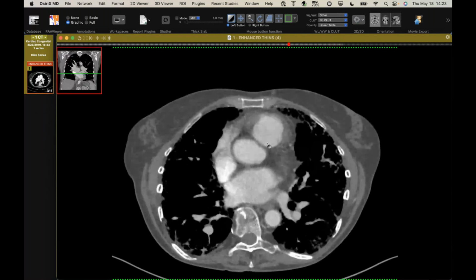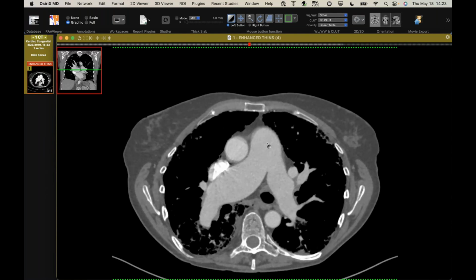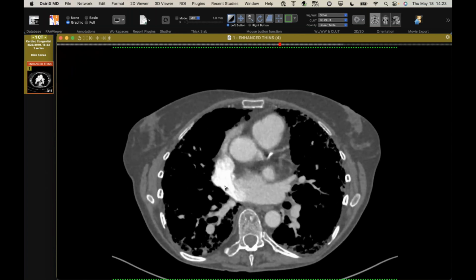You can see pulmonary hypertension in the setting of fibrotic lung disease, but usually it's not this severe unless they've got a secondary cause, like you can see it in systemic sclerosis. They can get it independent of the lung fibrosis, but really big like this, you have to think about something else as well. And indeed, she does have a shunt that you can see very nicely here.